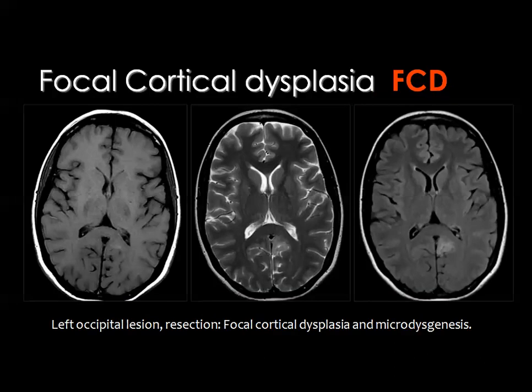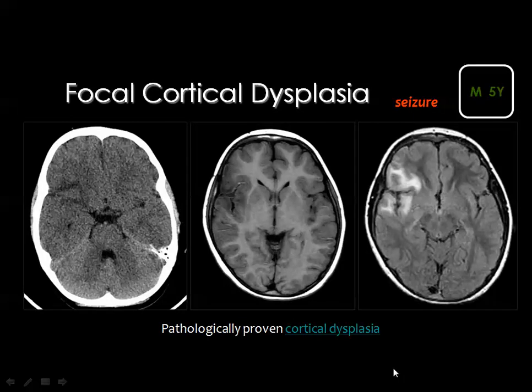And you see here an area of focal cortical dysplasia, which is not usually appreciated well in the T1 weighted images, but you can see it in the T2 and in the FLAIR images as well. And because sometimes the focal cortical dysplasia may simulate a neoplasm, especially the diffuse type of astrocytoma, you can see a lesion here.